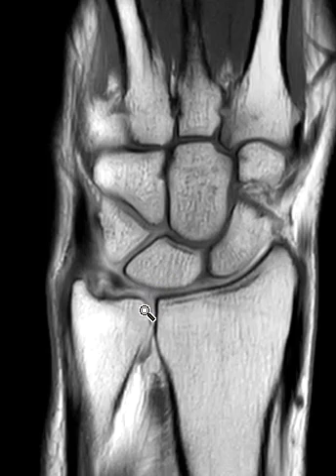And again, this is right at that borderline. It may be slightly more positive than it should be. And negative ulnar variance is when it's down too low, then there's abnormal stress between the radius and lunate, and they can have degenerative changes and marrow edema at the base of the lunate bone. But this is roughly neutral, if anything, slightly minimally positive. And now we're going to look for that TFCC.